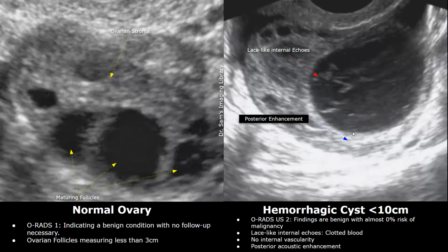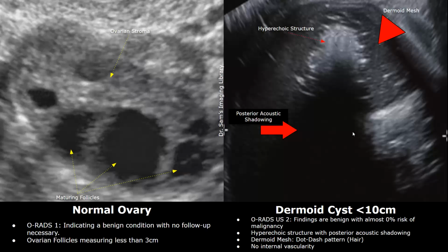A dermoid cyst is a cyst that contains teeth, hair, brain tissue, or fat. Usually they are benign. A dermoid cyst that measures less than 10 centimeters falls under O-RADS US 2. They have variable appearances on ultrasound. The appearance depends on the type of material found within the dermoid cyst.